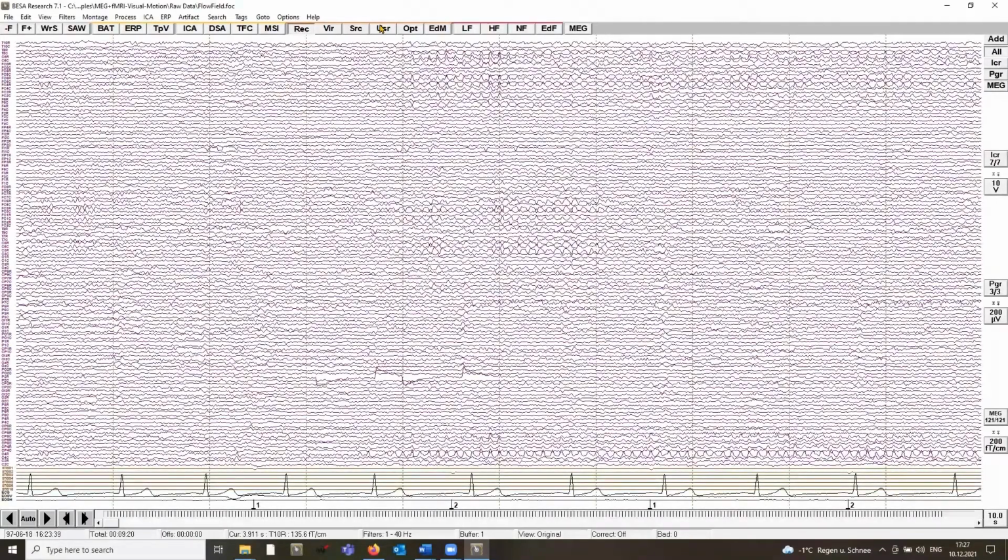In this video, we will use time domain beamforming technique to reveal brain activity related to a stimulus. As an example, we will work with an MEG dataset which presented a point cloud to the subject for short durations. In one case, the point cloud moved towards the subject, in the other, it was static.